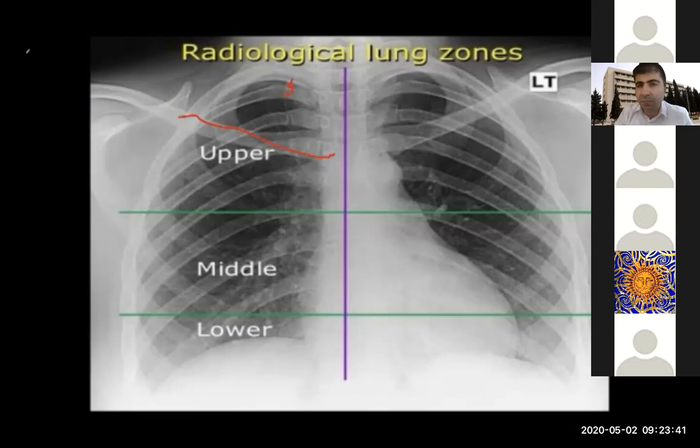You can see it over this chest X-ray, and you can see it over the heart, so you must not miss the mediastinum and the cardiac shadow. So by C, if you mention C, there are too many dark-colored streaks of air here. Regarding the mediastinum, there is a pneumomediastinum.